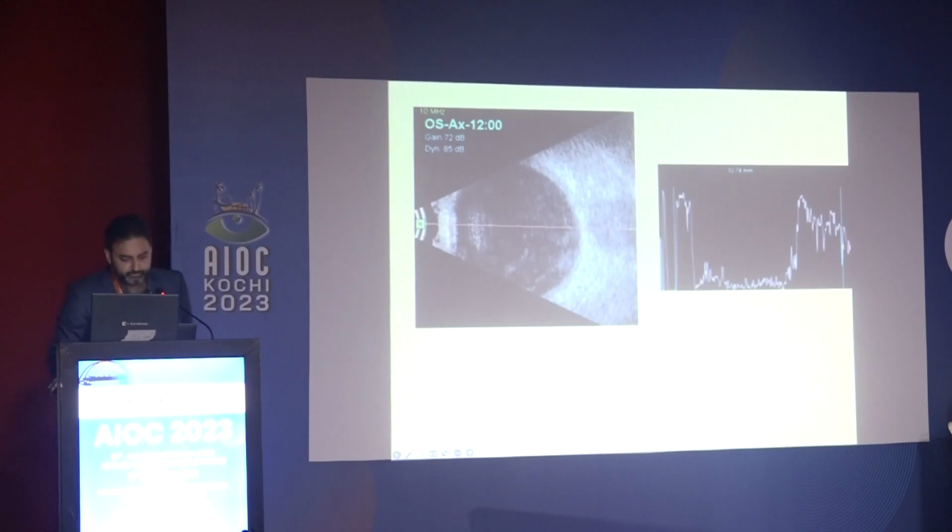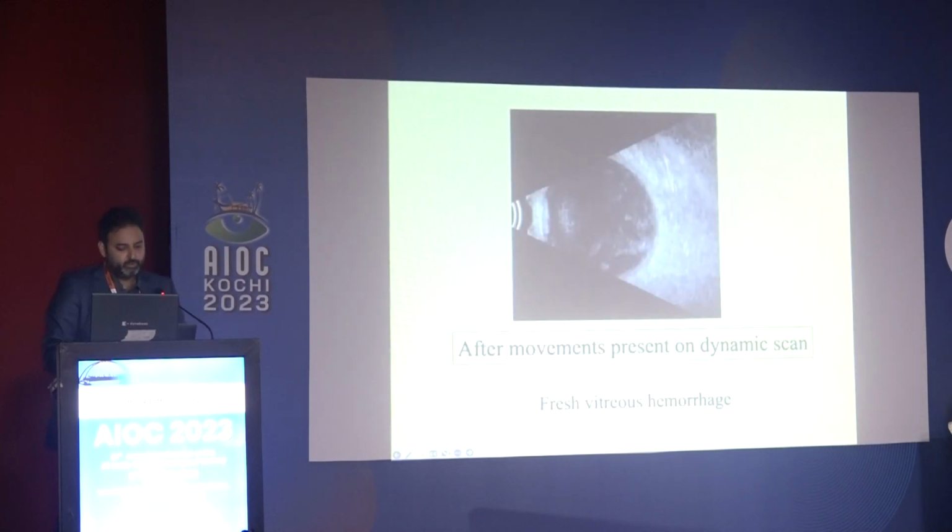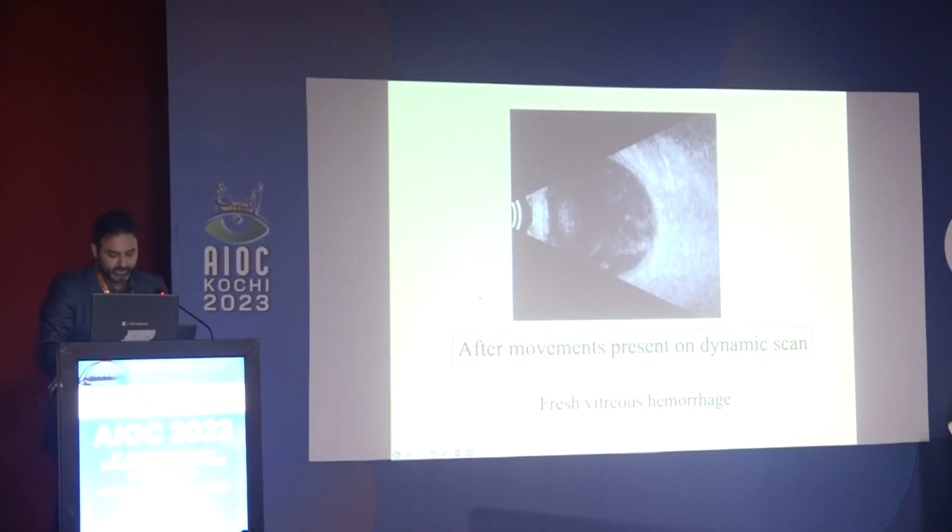Right? You have this. So multiple point-like echos. The internal echo intensity is low. Small dots, few lines, but they are majorly dots, right? So let's just mentally put it into the bracket of dot-like echos. Homogeneous all over. Reflectivity is low. None of these videos are running, unfortunately. I actually transferred this from another one, so I'll not be able to show you any dynamic scan, sorry. But you'll have to trust me on this.